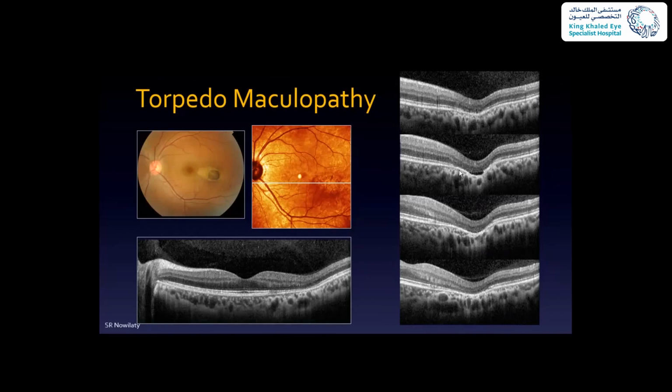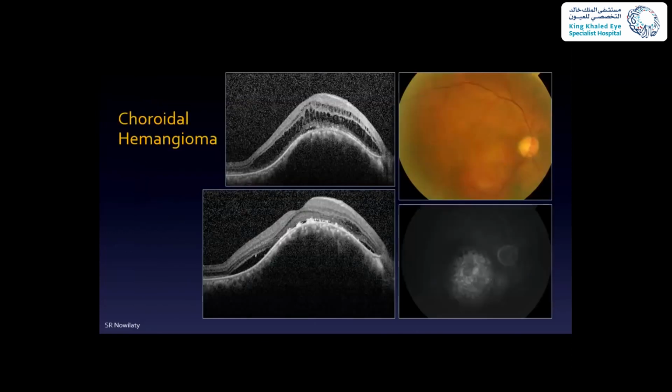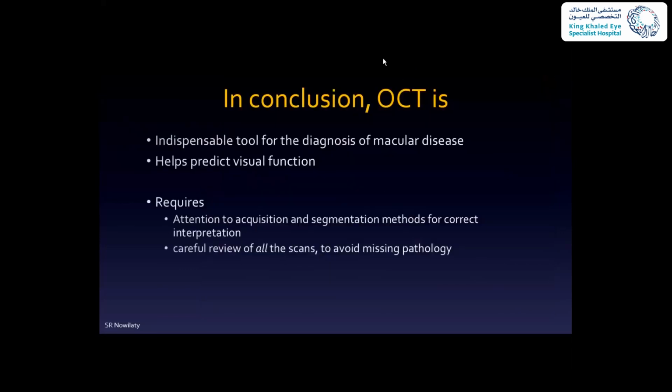So backwards bowing. And finally, I think this is the final, yeah, the choroidal hemangiomas and tumors of the retina, where the OCT can show the bulging, can sometimes show the hyporeflectivity, and oftentimes it shows the outer retinal problems that happen with choroidal tumors, such as fluid and RPE atrophy from constant fluid input. Okay, so I think we're done.